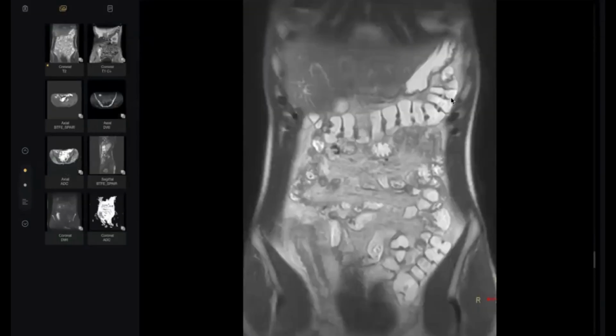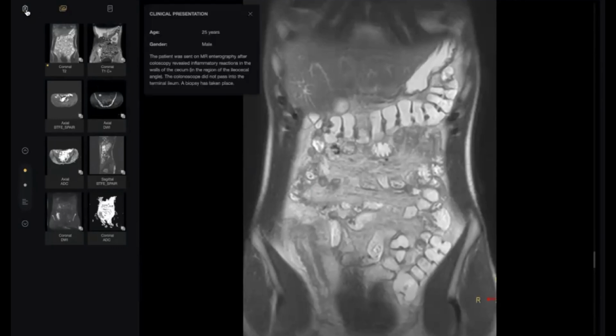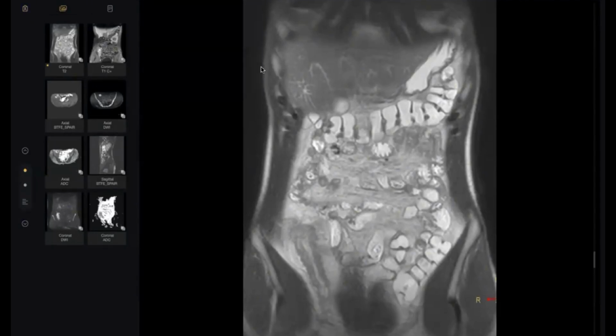Next candidate. Thank you, sir. Welcome. Hello, Assalamualaikum. Don't worry, my colleagues, I'm trying to concentrate on the examinations that we are not familiar with, to cover everything. Alaikum assalam, doctor. This is a 25-year-old male patient with abdominal pain. Request control, please.